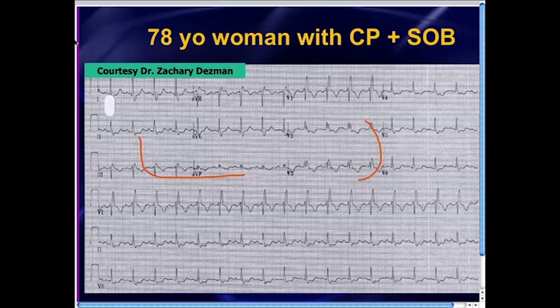So just 3 more cases to build on top of the video cast that we did back in December 2011, which talked about T-wave inversions in PE. Here's another 3 more cases demonstrating this is not an uncommon finding. Large PEs will produce T-wave inversions that mimic inferior and anteroseptal ischemia. So, simple bottom line.